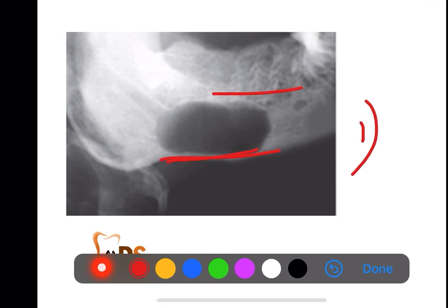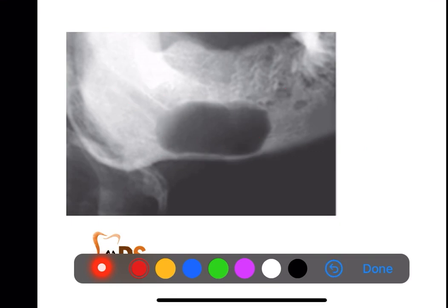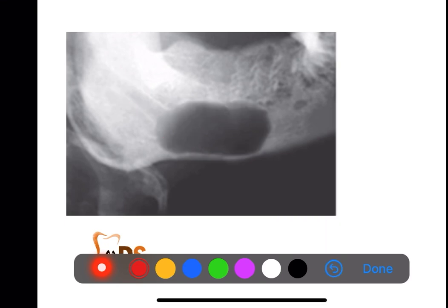It is near to the tooth, but if you clearly observe, it is with the mandibular canal, right? So there is some abnormality with the mandibular canal. Here the very first step identifies that it is within the canal. So the finding is within the canal. So it is a neuroma or some abnormality which is seen within the canal.